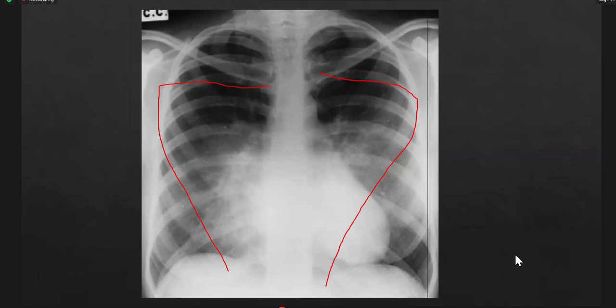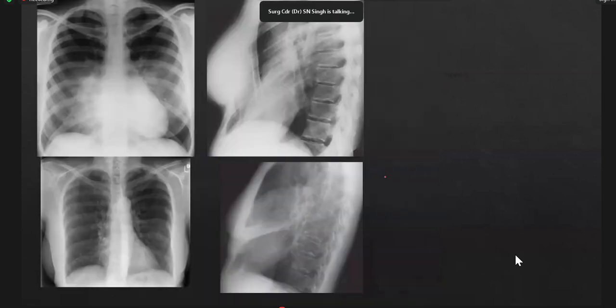So now you have middle lobe collapse consolidation, lower lobe collapse consolidation. Third you said something, and fourth is pectus excavatum. With this, you take a history of whether there is an infectious history. Infectious means fever, pneumonitis and all. If it is an infectious history, a history of infection or fever, inflammation, then it is a consolidation collapse. If it is not, then I will go for a lateral chest X-ray.